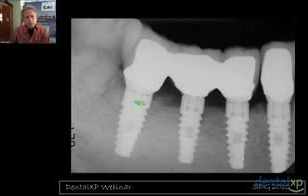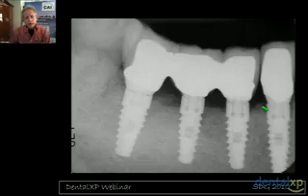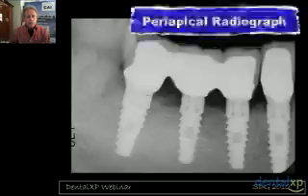Here is the bone grafted case, the bone grafted implant. This is the transitional placement here. You can see where the bone level is, exactly as we had planned it. And here you can see we have one interproximal peak of bone, and then the remodeling that occurs directly in this area down to the zone between the 8 and the 12 micron grooves of the microchannels for the Laser-Lok surface technology.